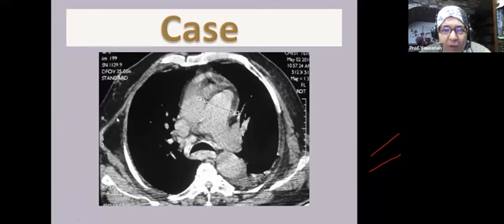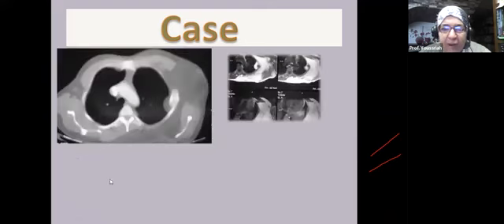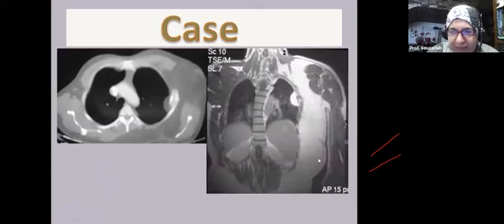Now, on the right side here, we have a lipoma, a deep lipoma to the muscles. And this is another case. As you can see here, we have extensive fat on the left chest wall, but look upwards in the same image, you can see subcutaneous fat separated by the fascia from the deep lesion. So they are not communicating. This is deep fat, not subcutaneous, so it is not a lipomatosis. If we find communication with subcutaneous fat, we call it lipomatosis.